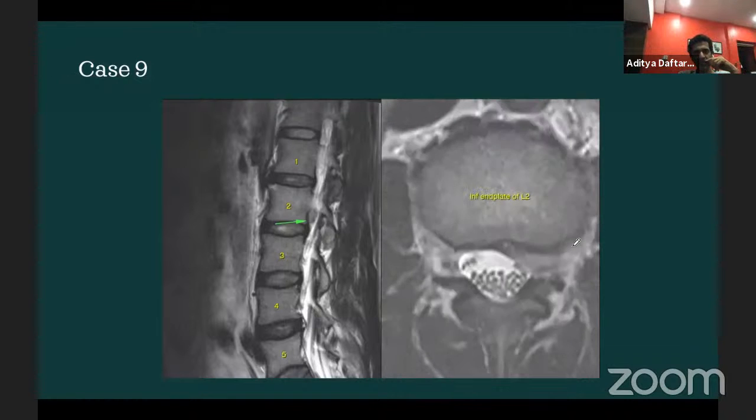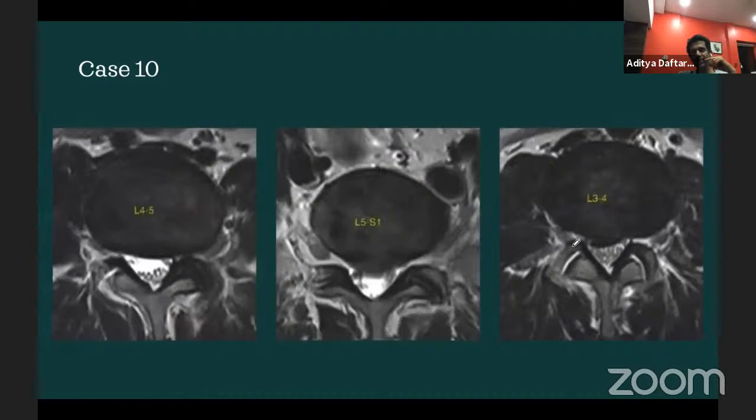Okay. That being said, the other one that you're going to look at is, say, for example, in this case, you see these large discs, they are mostly right-sided, but the patient has left-sided symptoms. And when you look at it carefully, you see over here that at the L4-5, there's an extraforaminal disc, which is actually impinging on this L4 nerve root. Here it is just in close proximity, it's not really impinging on it. And here it's not anywhere near it. So even though you have primarily right-sided discs, the patient's symptoms are more left-sided and relate to L4. So remember to look very carefully for extraforaminal discs on the axial images. You can also see these well on parasagittal images like I showed you earlier in the normal section.